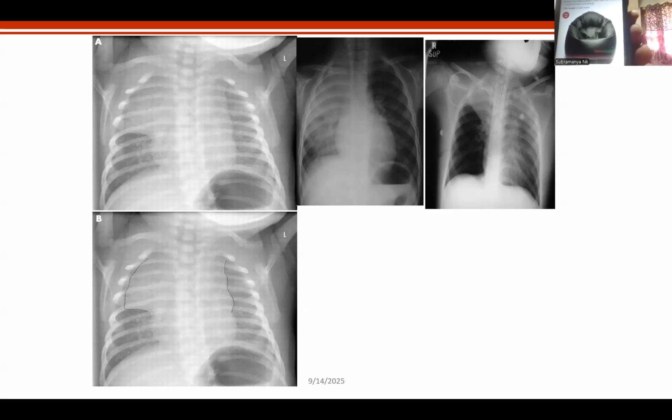Thymus is like that. It fits in the chest. Wherever it goes, it fits in there. It will never cause displacement of any of the intrathoracic structures. Please remember, understand. Don't try to learn by heart. This is very, very important. A thymus comfortably fills whichever area is available to it. That's why it's called cardiothymus. It can come on the cardiac border. It can come on the right, left. More often, it comes onto the right.